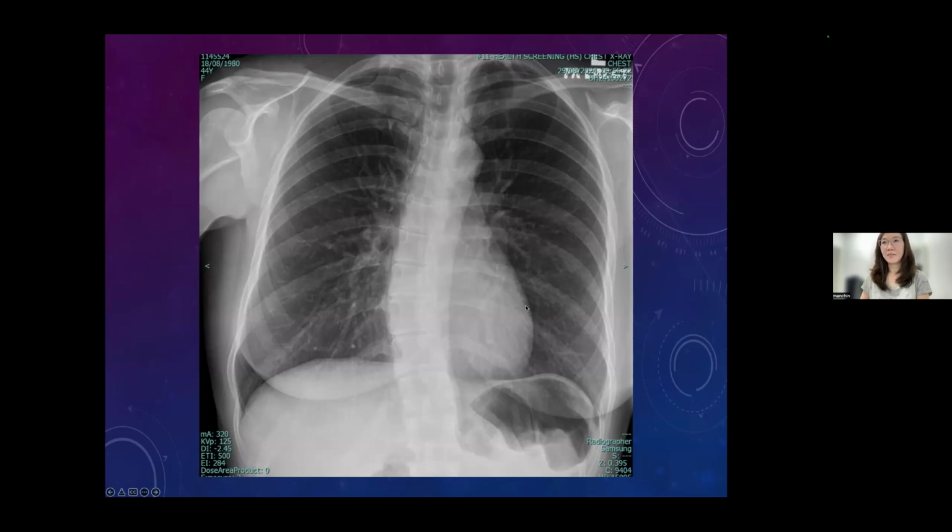Apical, lung field both sides, costophrenic angle. Right upper lobe, azygous lobe. Yes, Jiaqi again, she got the right answer. So this is the azygous lobe. This normal variant is not abnormal and it occurs in 0.4% of all X-rays. This is a part one MRCP part one exam question or even FRCR.